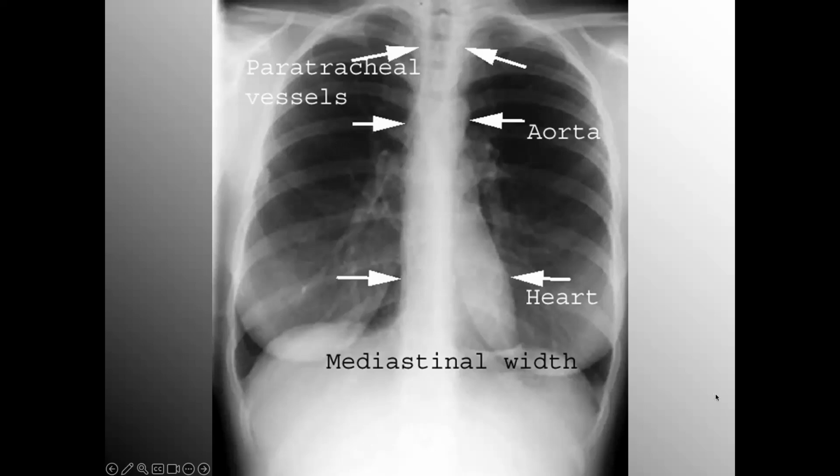I know this patient has some degree of hyperinflation. Is it air trapping? Well, clinical history would tell that story. Are they at full inspiration or full expiration? That would tell the story, but I know I can easily say with confidence they've got some increased lucency of the mid-lung, increased rib spacing. There's definitely some hyperinflation in the mid-lung.